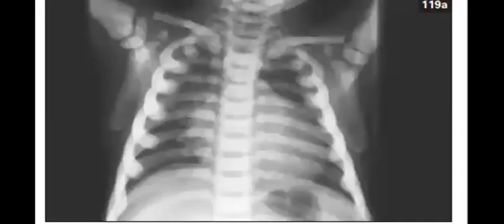Let's have this case. I think I shared one similar to this case in the group. 4 years old, presented with suspected chest infection. Then differential diagnosis: generalized increase in bone density in pediatric age group. Perfect.